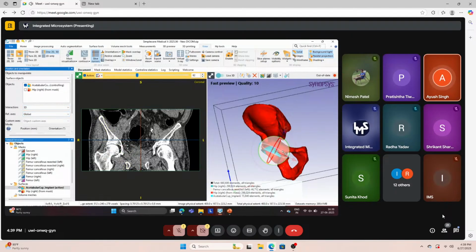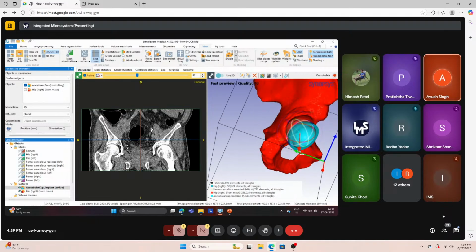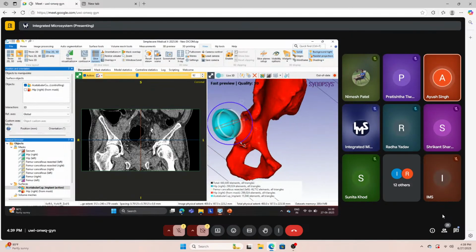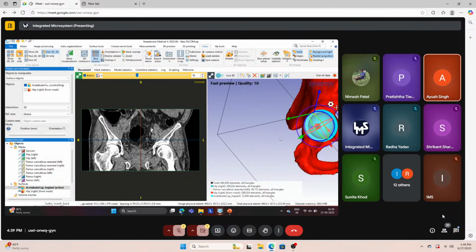We can also make the same changes in the 3D view, just by facing the vectors accordingly, as required for one specific workflow. Once it is done, we'll be rotating over here, and a little bit over here.